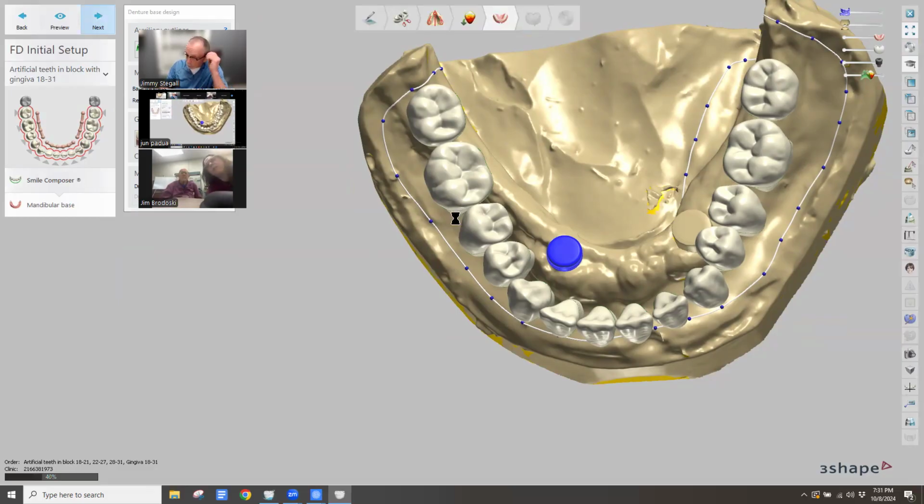My goal with the locator dentures, if I feel like I can get the full 3.5 millimeters thickness around those attachments of denture base, then I'm pretty confident with the strength, and I don't think about a strengthener. If because of space or position like this one, I'm going to have to make it thinner, then I'm thinking about some sort of strengthener.